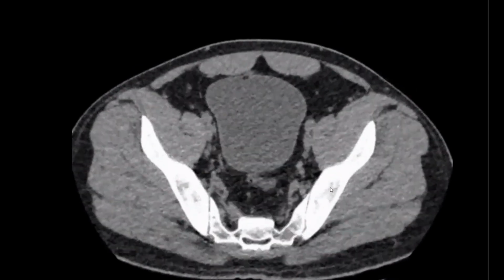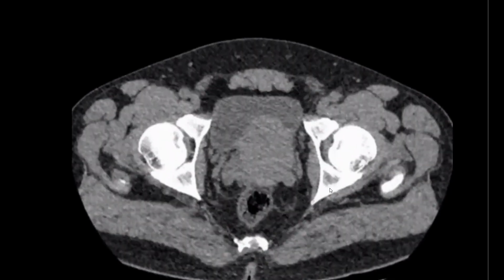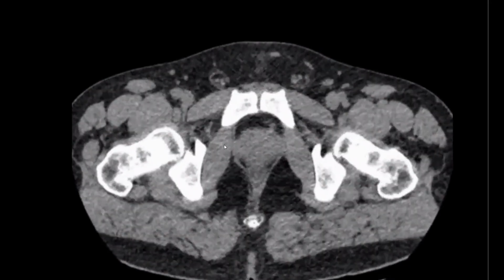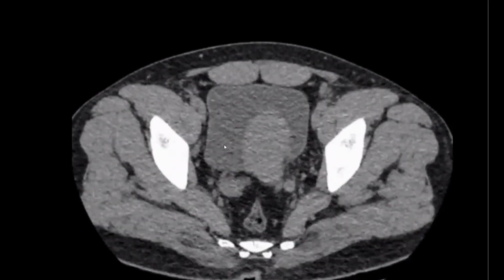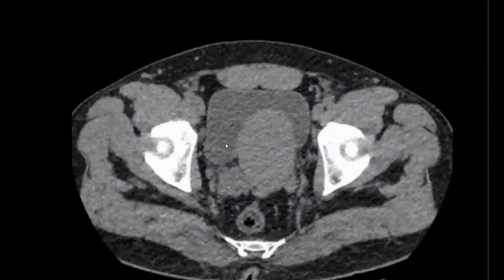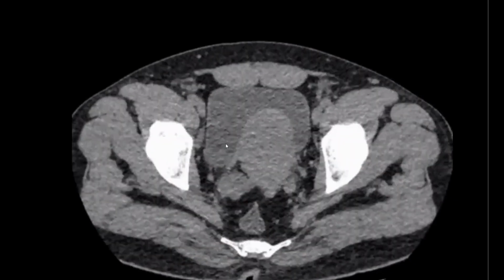I would like to proceed with the post-contrast images, if available, to further characterize the lesion. Do you have any more idea to characterize this lesion? As I see that the left kidney is also absent, do you think MRI would be helpful in this case or not? Yes, I think I should go with MRI.